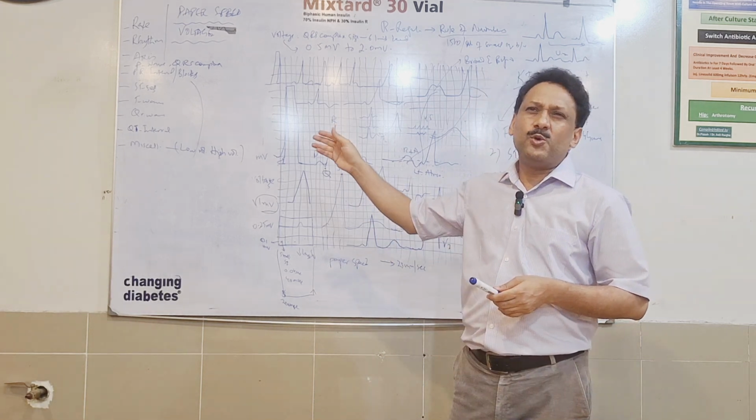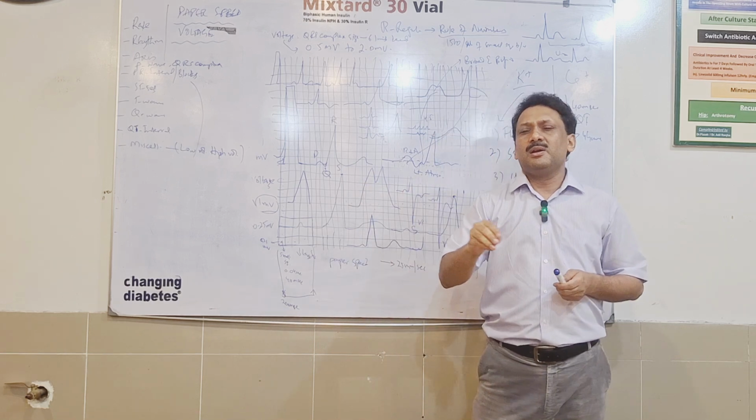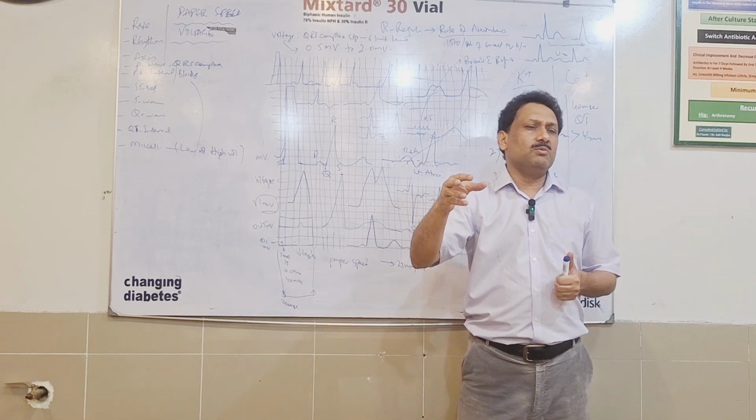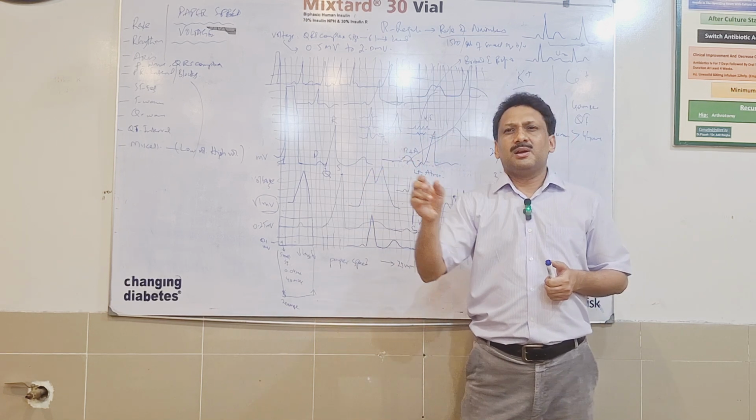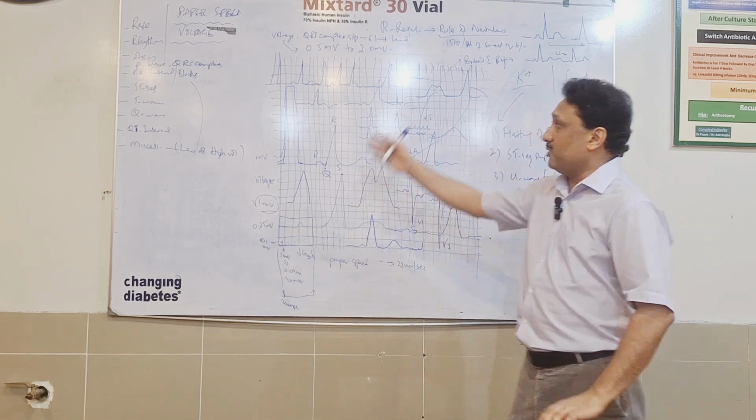I mean, a few other things can be there in ECG, but this is what I wanted to highlight here. You can read WPW, you can read a few other things. Those will fall in the miscellaneous category, but this is what we were interested in.